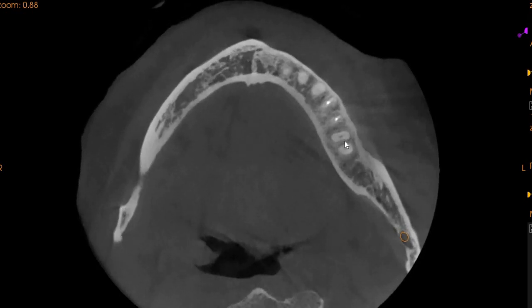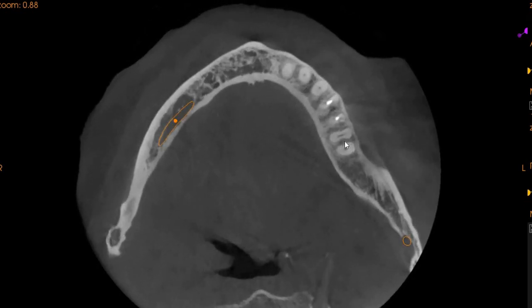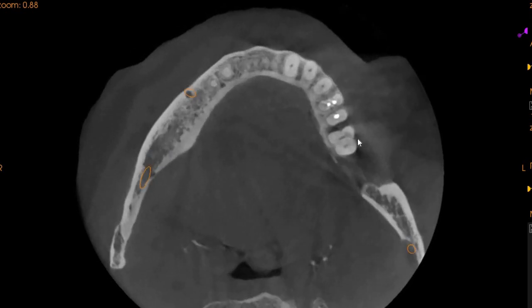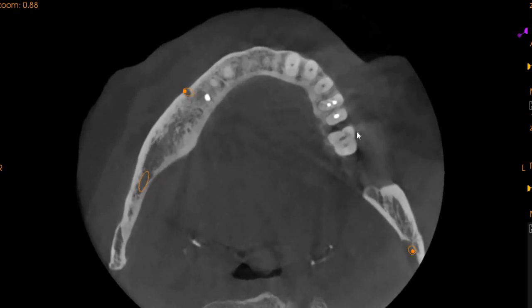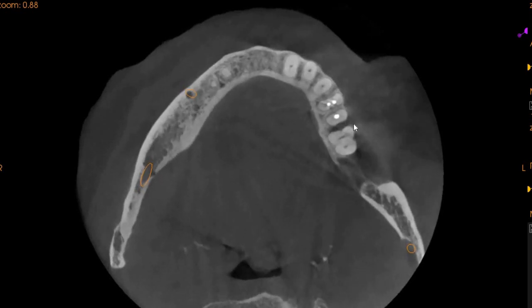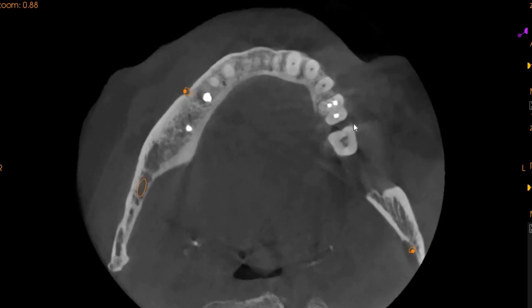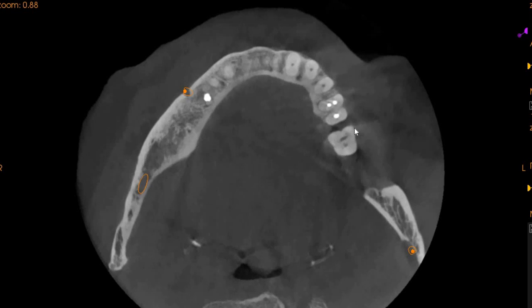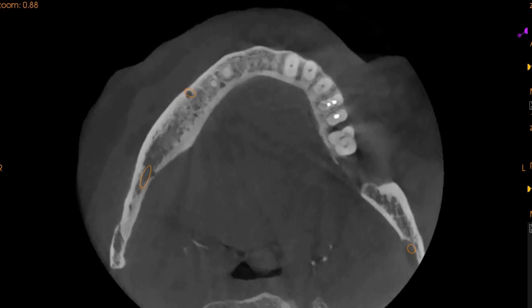As we move upward, the only thing noteworthy on the axial view is that there is a slight appearance of a crack on the mesiobuccal region. We cannot verify the crack on any of the other planes, just the axial plane. So we will ask the kind doctor to please evaluate this area clinically as well. The crack goes at the mid root level.